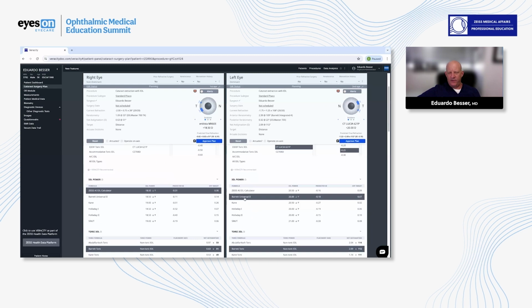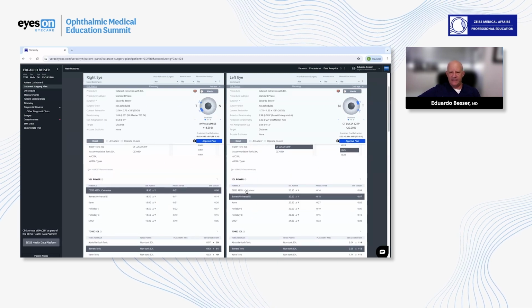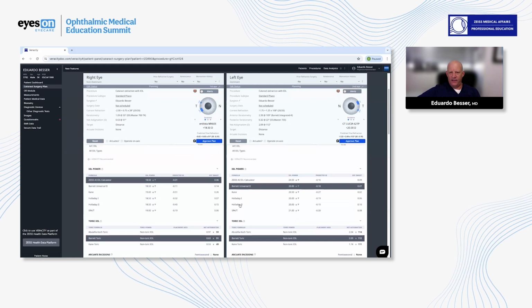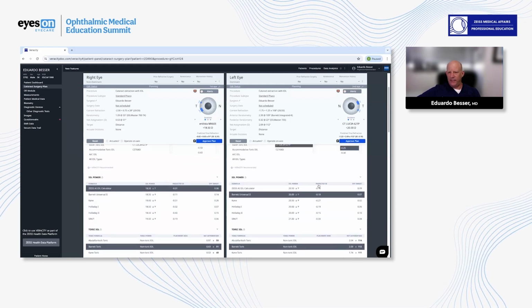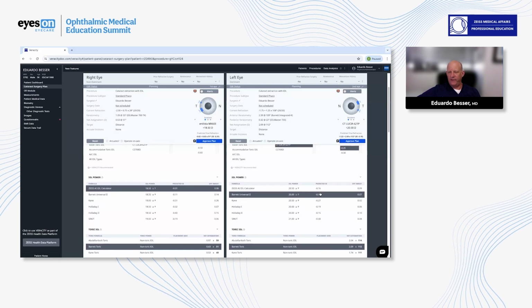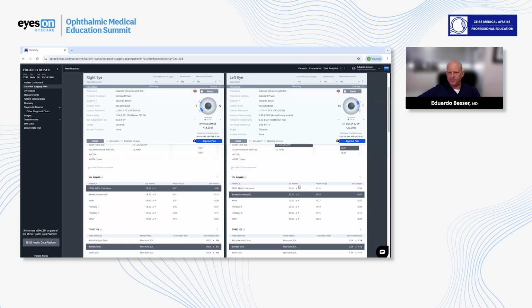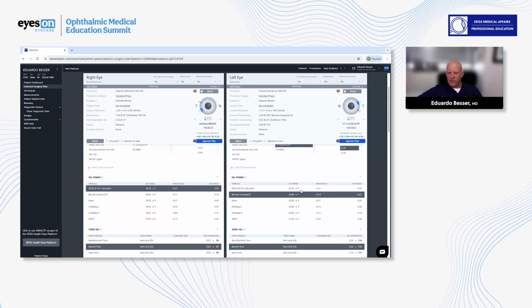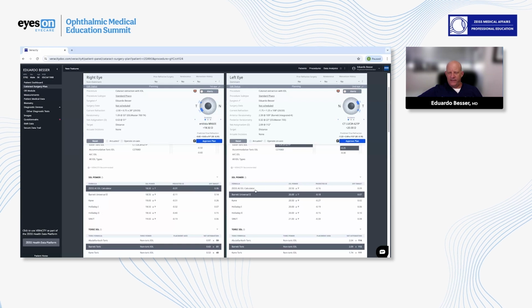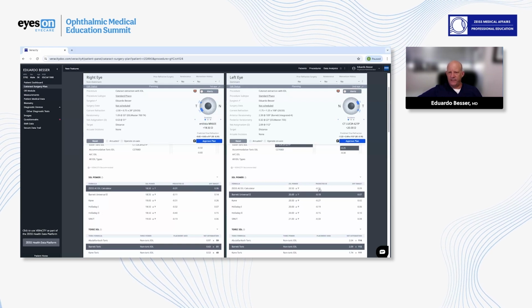Here, rather than only having the Barrett universal formula, now I have the Zeiss formula, the Kane, and the Holladay formulas, and the SRK/T. Each formula gives you a predicted spherical equivalent. So you can look at all of them as opposed to just a single formula. Furthermore, these little arrows are live. So the Zeiss AI calculator saying 20.5 is going to give me -0.16 spherical equivalent.